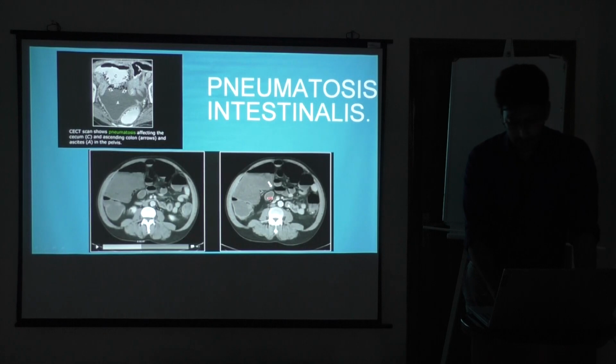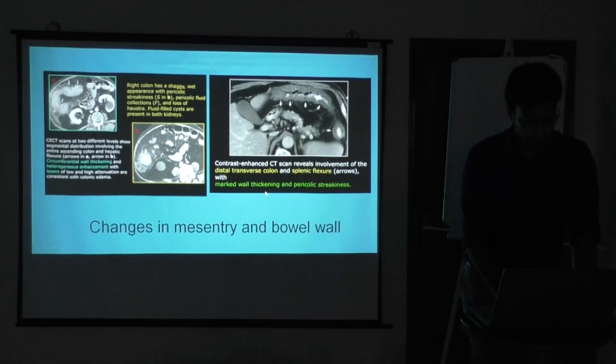So in the next slide you can see, this is a bit difficult to identify. The same thing. You can see black color, small here, the white arrow is showing all along you can see. So simple question, this gas is floating, air is floating, this is not. So that means something is abnormal. Then you can think of wrong things.